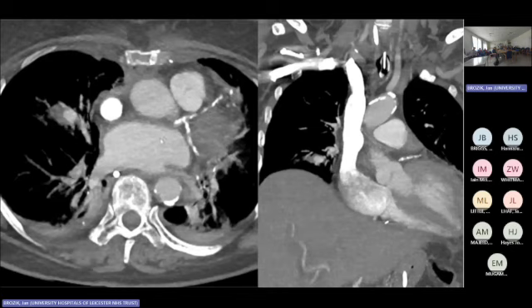Okay, a patient probably 9-10 years ago on this unit, someone who had cardiac surgery, and after cardiac surgery they developed hemoptysis. So this is not the best image, but this is what we've got. But can someone tell me why they developed hemoptysis?